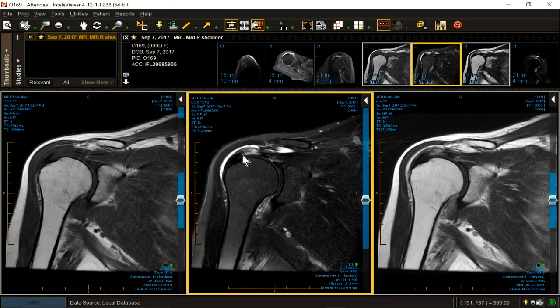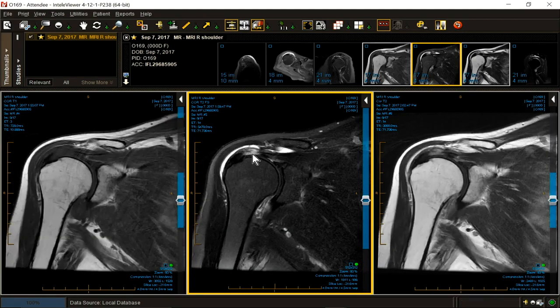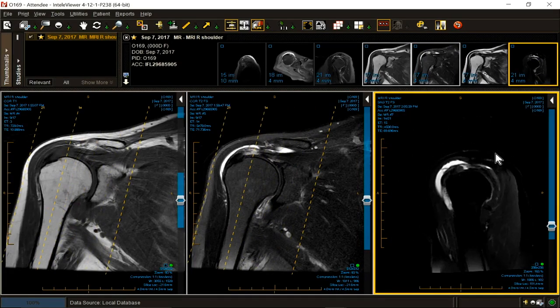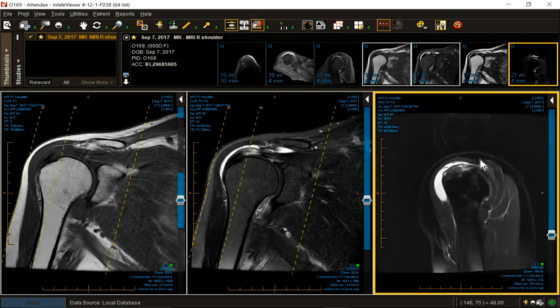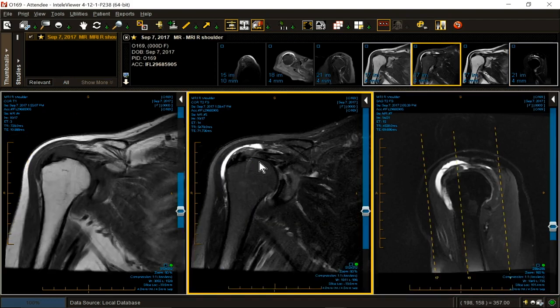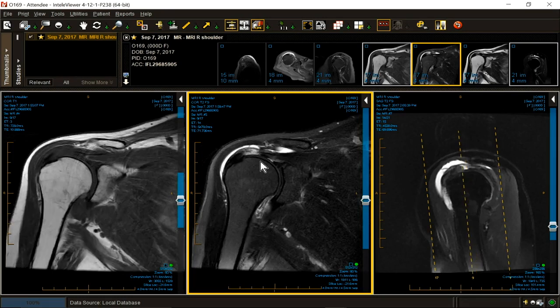So clearly, it is medial to the footplate or footprint. Some of you are probably struggling with whether it is full thickness or not full thickness. It has been said that excessive bursitis is a sign of a full thickness tear. This is unreliable. So what would I do with a case like this?